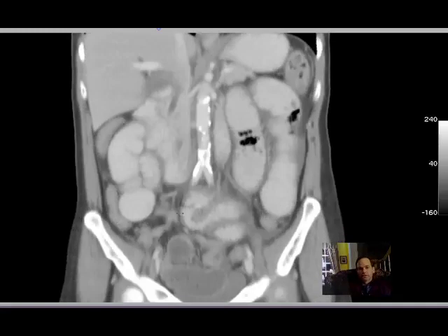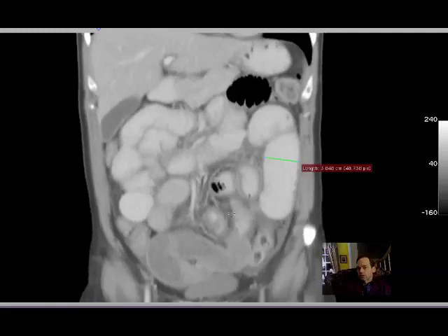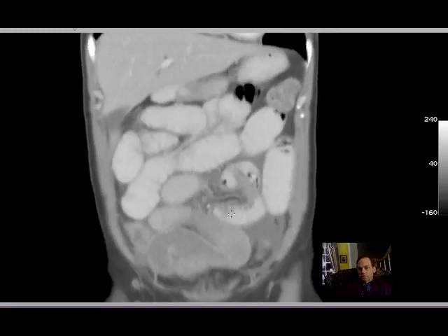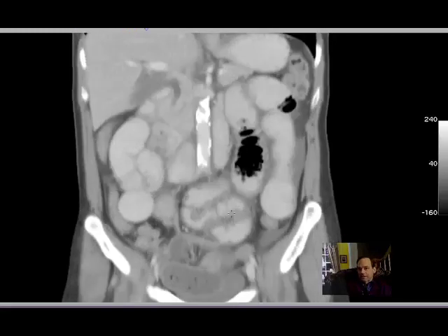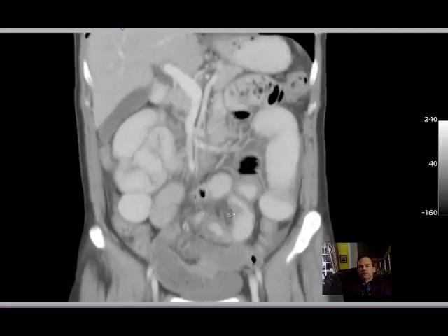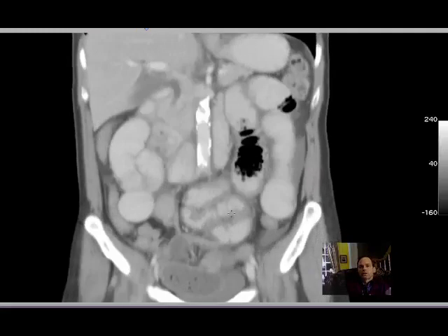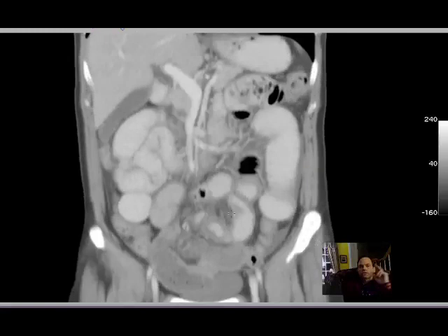Yes, you probably have noticed that some of the walls of the bowel here are thickened, and in this case I'm not sure why. It may be some inflammatory process. It could be just the severe peristalsis in that area, but it does look abnormal. But I don't want to spend too much time on that. I think you get the general principles of what are the important salient features of small bowel obstruction.